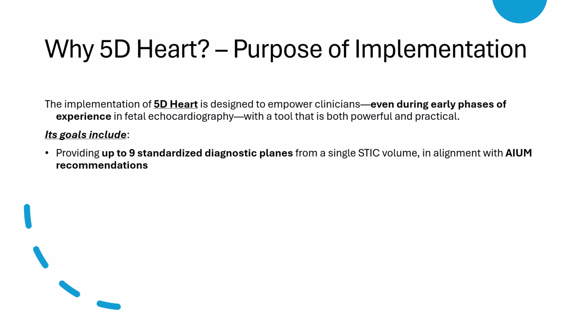Nine essential cardiac planes automatically extracted from a single STIC volume, aligning with the gold standard guidelines from the AIUM. High reproducibility and reliability, ensuring diagnostic consistency across different patients and operators.